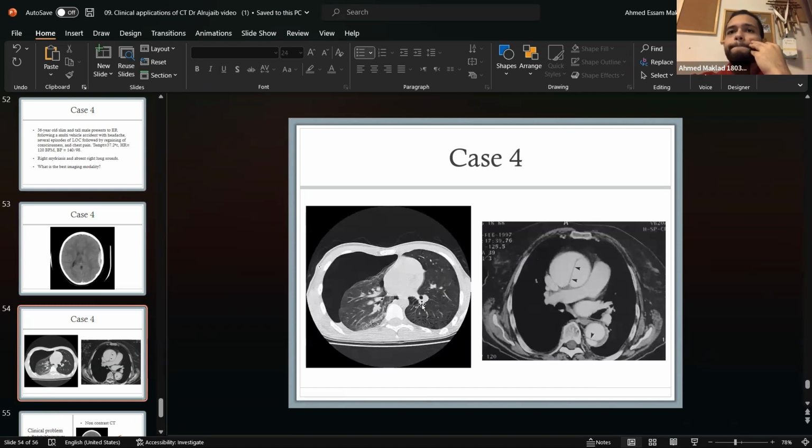And what is this right here? This is a pneumothorax. See, this is very dark, indicating air, and you can see that the lung is compressed. All right, the lung is pushed down by this air right here. So this is a tension pneumothorax. What do you guys think this is?